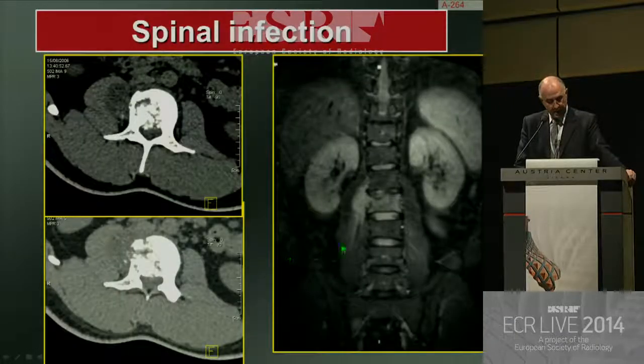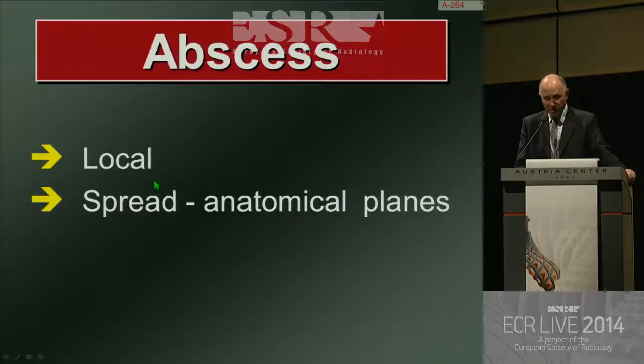In the same way as we saw before, the vertebritis breaks the cortex and allows pus to escape into neighboring soft tissues. In this case, not only has it gone into the disc, but it's also gone into the neighboring psoas muscle, and you can see multiple pieces of bone here, multiple sequestra with abscess formation by migration into the psoas space, as well as the epidural space.